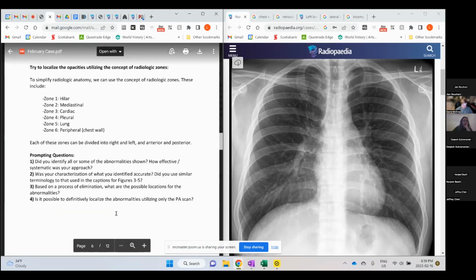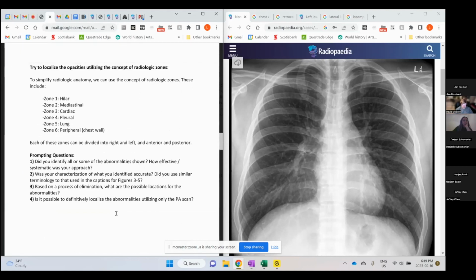I think hypothetically it could be parenchymal too, but this case is basically pathognomonic, so I know it's not parenchymal. But if it was immediately subpleural, that's plausible. But yeah, these are pleural.